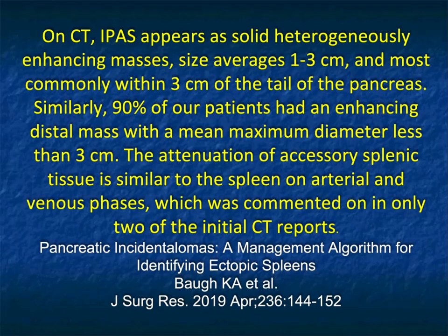And in part 3, we were speaking about the pancreas, and we went through a number of different issues with the pancreas. And I thought I would save one as kind of a transition between pancreas and spleen. I think one of the most common challenging events in terms of pancreatic imaging is a small vascular lesion by the tail of the pancreas, where the question is, am I dealing with a neuroendocrine tumor or am I dealing with an accessory spleen? These accessory spleens or ectopic spleens can sit just near the tail of the pancreas or on the tail of the pancreas.